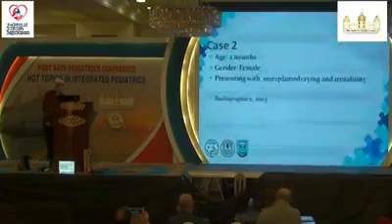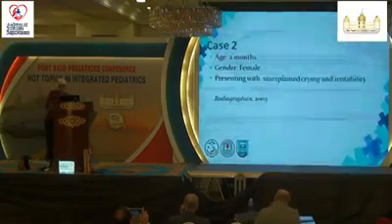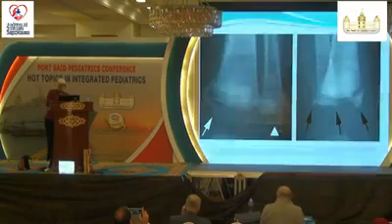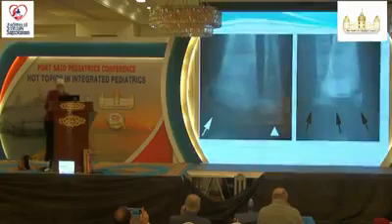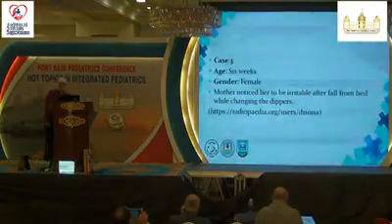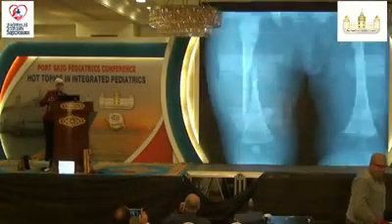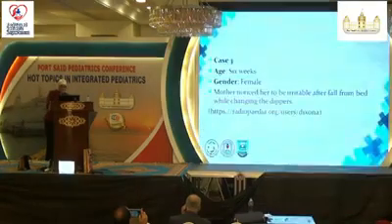Case number 2, age 2 months, female, presenting with unexplained crying and irritability. Vague history. Again, this is what we call metaphyseal lucencies and corner metaphyseal fractures, very specific, of course with a history. Case number 3, 6 weeks, female. Mother noticed her to be irritable after a fall from the bed while changing the diapers. And we found this spiral, very long fracture on the right femur. The baby is only 6 weeks.